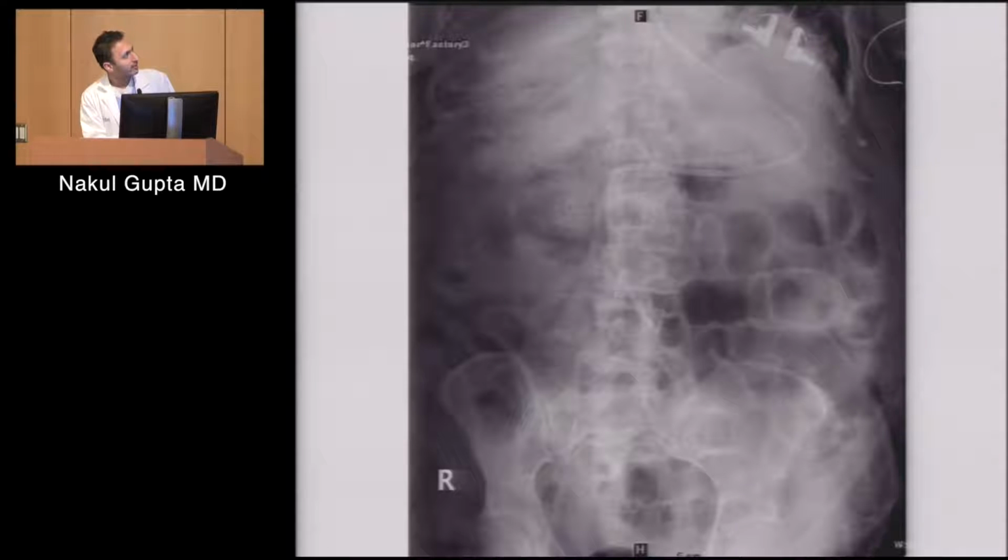Also, this is one of those cases where you can see the gallstones. A lot of times they'll be hexagonal shaped, or they have these geometric shapes to them, and a lot of times centrally they may even have gas in them. So these are classic gallstones, and this is what we'll see in the right upper quadrant. Here's the liver up here, so the gallbladder's probably hanging down like that, and there are stones in the fundus. He also has the Dobhoff tube, incidentally, which is in probably the second to third portion of the duodenum, a satisfactory position. All right.